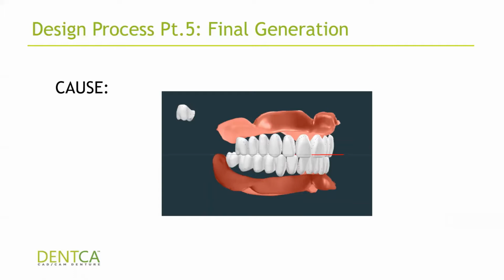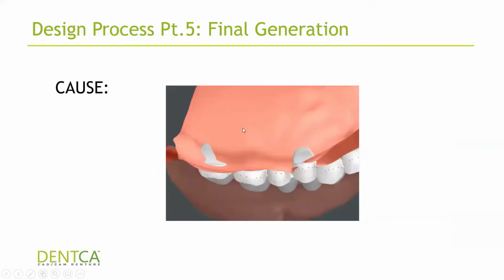So unfortunately in this case, either you remove all second molars or none at all. So don't try to do this, it's going to cause an error. So you have to make sure that's not the case.